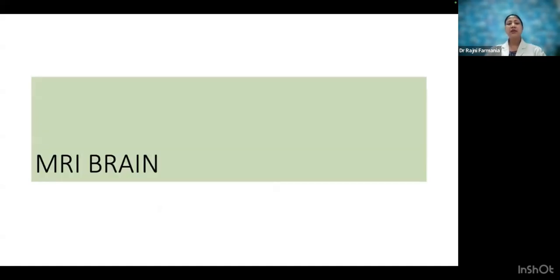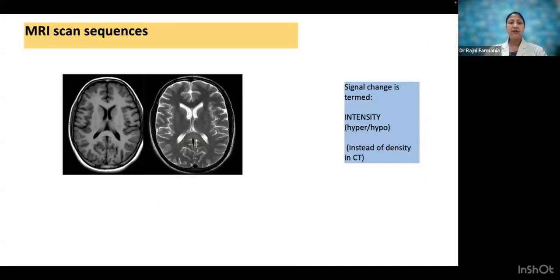So coming to the MRI brain. I'll tell you the basic sequences.